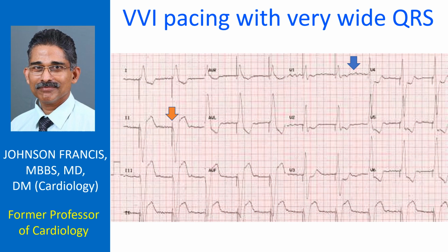in those who are not pacemaker dependent. Another possibility to be considered when atrial fibrillation is seen in a paced ECG is the implantation of a pacemaker after ablation of the AV node in refractory atrial fibrillation, in which rate control with drugs has either failed or has produced intolerable side effects.